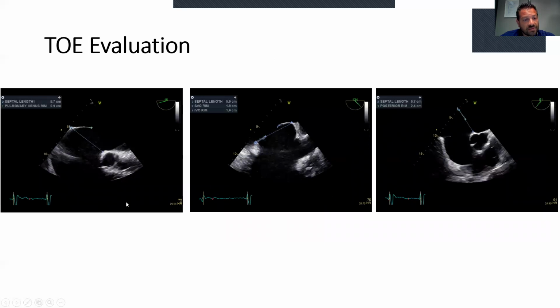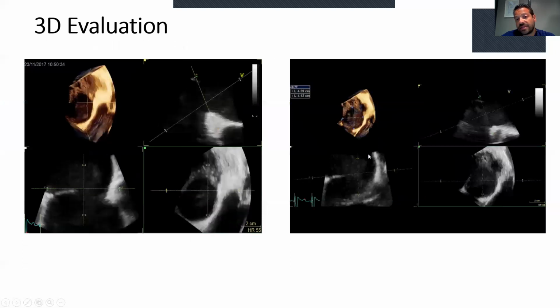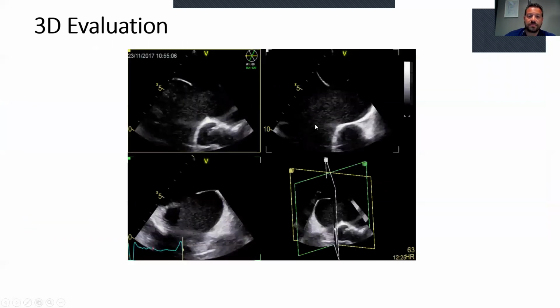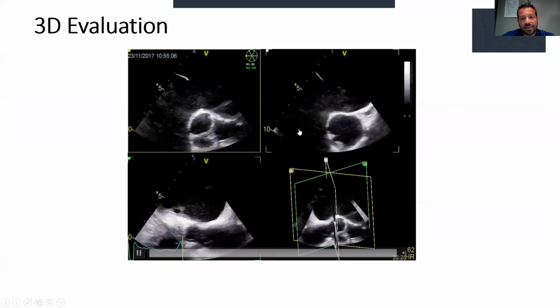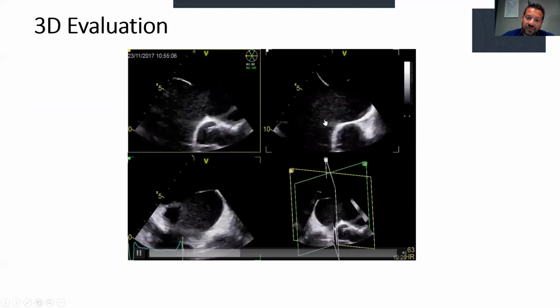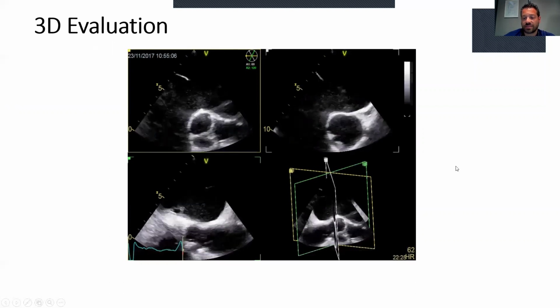But at 4-chamber view, we saw that we also didn't have an atrioventricular rim. And of course, we measured the length and the diameters of this defect, and we saw that it was 4.4 centimeters by 4.1 centimeters. So this is a triplane view of this defect. As I told you before, we don't have aortic rim, we don't have atrioventricular rim, and all other rims are present.